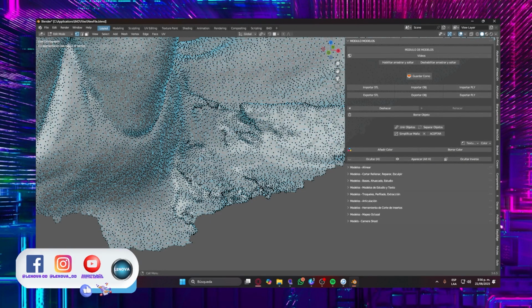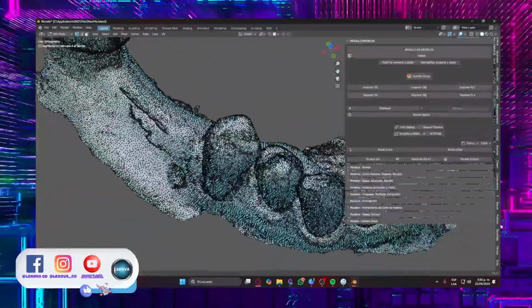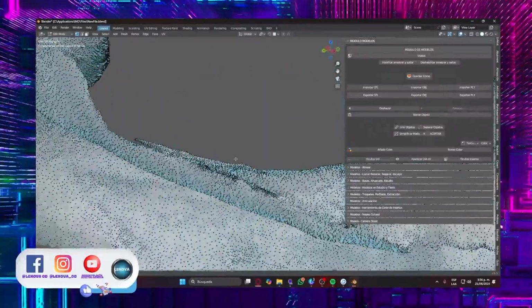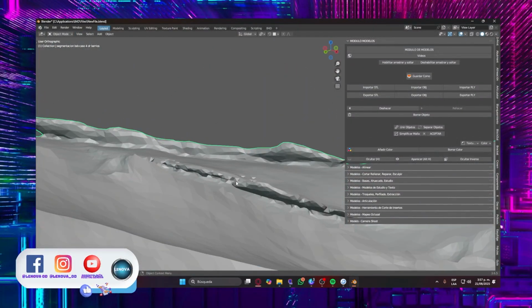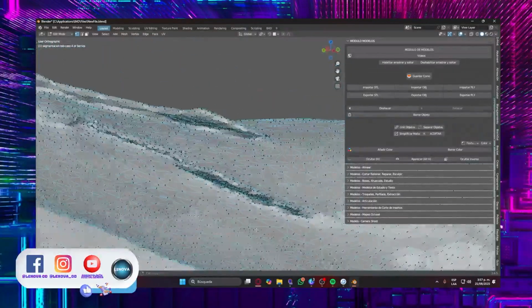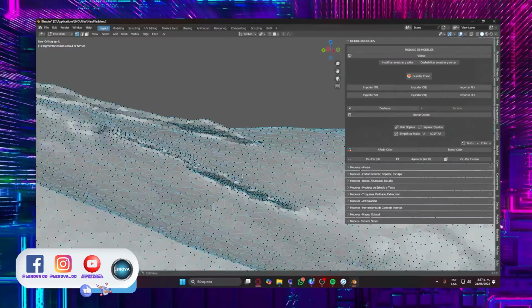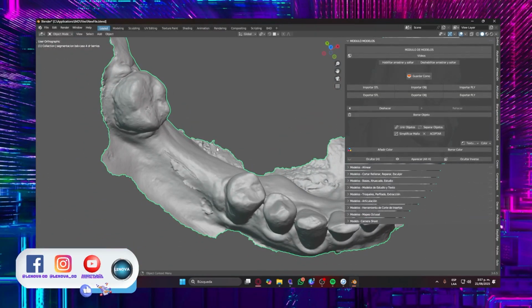Ready? Because the scanner is not the only problem. You also have to train in its use so that these types of errors don't happen to us. Look at the other mesh errors, right? I mean, this is a fault. This is what we see in the software, and this is what we see structurally within the software. And obviously, this will not generate any benefit for me in the design. I must fix it. And that must be done in all programs, regardless of the user working in.